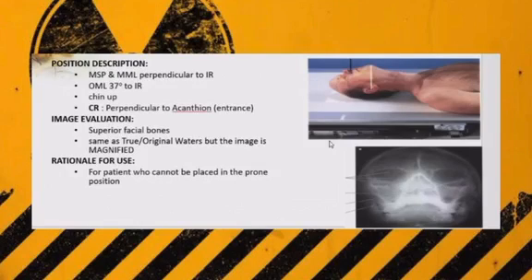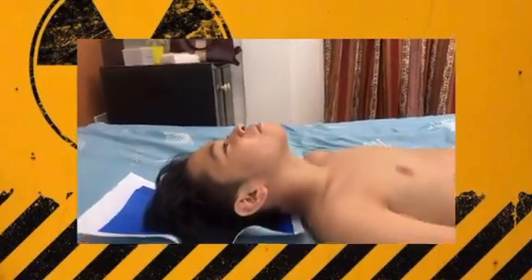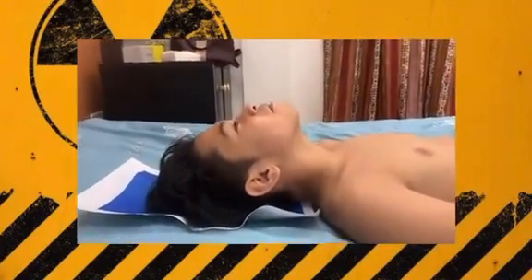So the image evaluation. Superior facial bones, same as true or original Waters, but the image is magnified. Rationale for use: for patient who cannot be placed in the prone position. So, these are the example of the reverse Waters method, acanthoparietal projection.